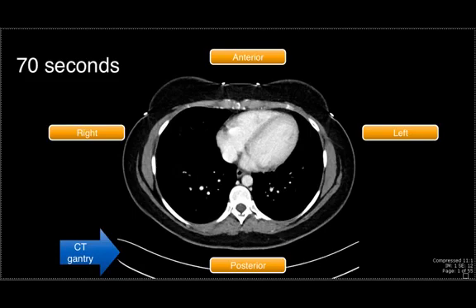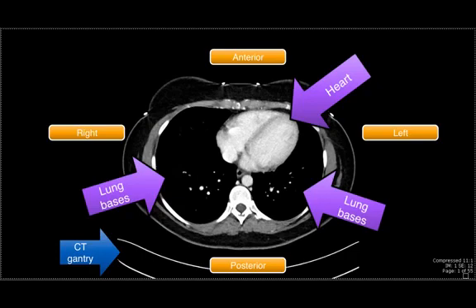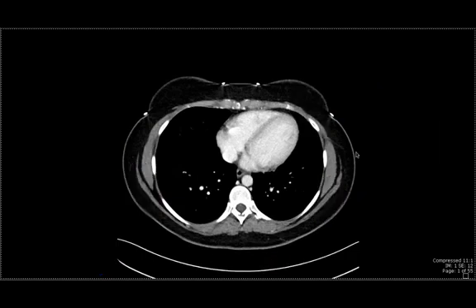Secondly, whereas this is a CT scan of the abdomen, it's important to realize that we also include a portion of the lung bases and with it the heart, because in doing so, we make sure that we image the entire superiormost aspect of the abdominal organs. As we scroll through these images, we're going to be scrolling caudally, that is, towards the feet of the patient.